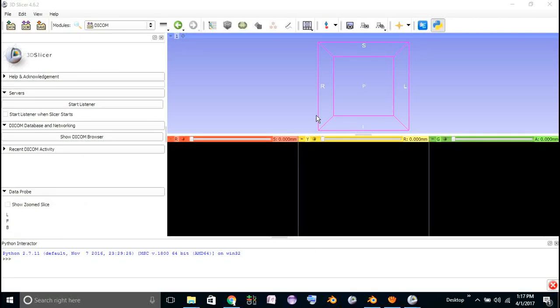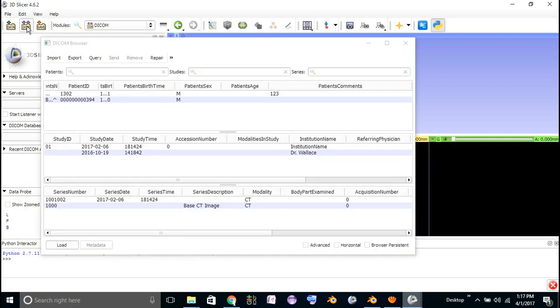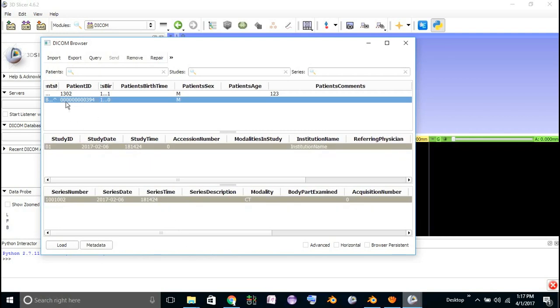Alright, so now I'm going to show you how to import your DICOM into Slicer and link up your plan from Blender with Slicer. Okay, so first we come to the load DICOM data. You may have to file import stuff first, but I've preloaded yours. So I'll select it here. I've hidden the patient name and the patient birth date. So first we'll load this up.